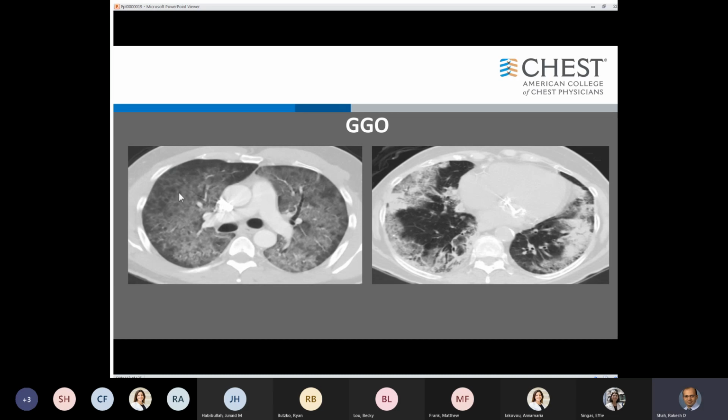Now, if you look at the case here, whenever there is ground glass opacity or an alveolar filling process, it will tend to be diffuse throughout the lung parenchyma, and you will never see those sharp edges which I showed you, and I'm going to show you some more. It will just tend to go everywhere, right? Nothing is sharp here in any of this.